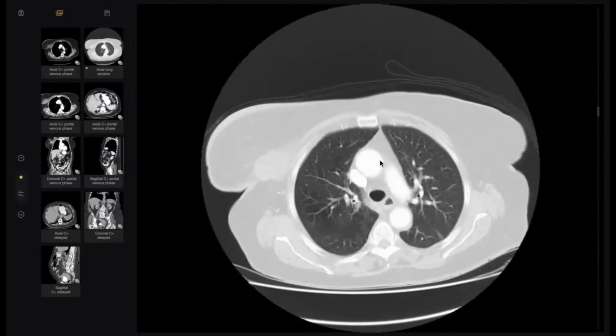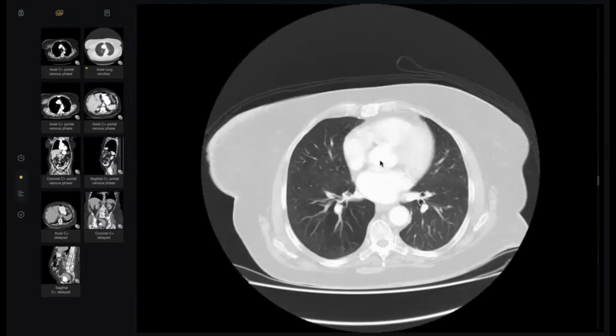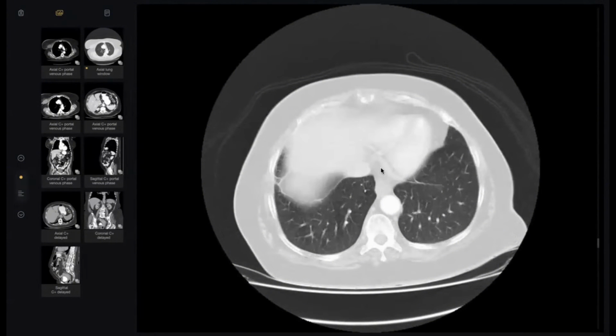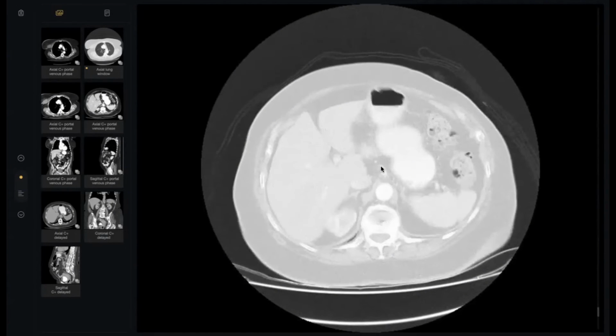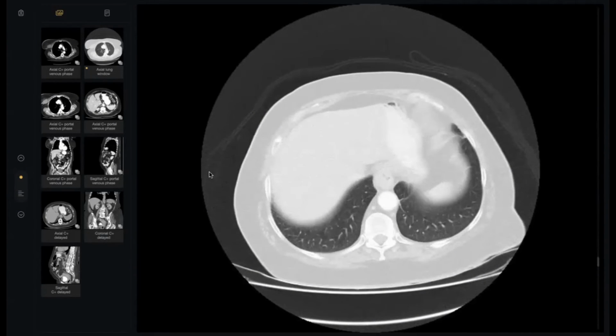Just a few air-filled pulmonary cysts. Areas of mosaic attenuation suggesting small airways or small vessel disease. Subsegmental atelectasis in the right lower lobe or in the lung bases on both sides. No suspicious lung lesion. Choose the last window that I can give to you. The last window, and why?